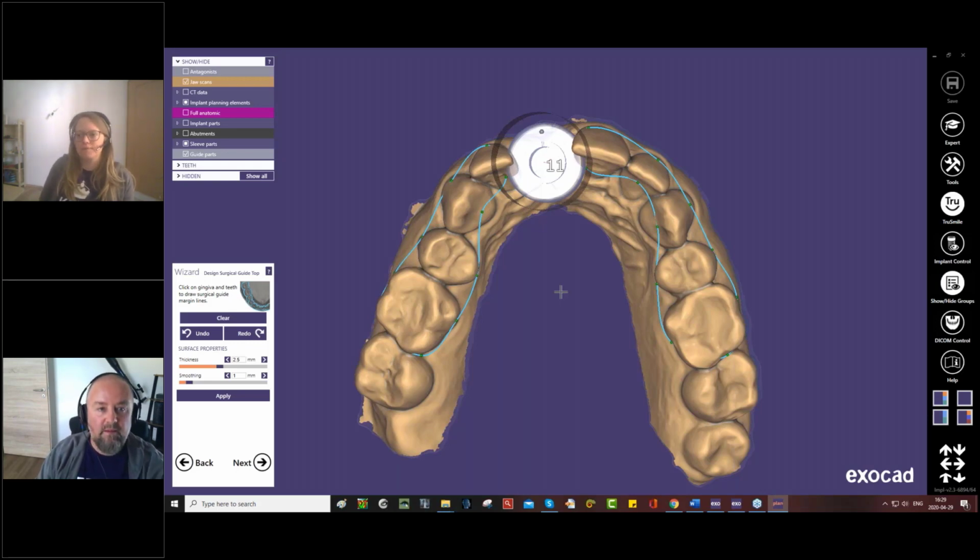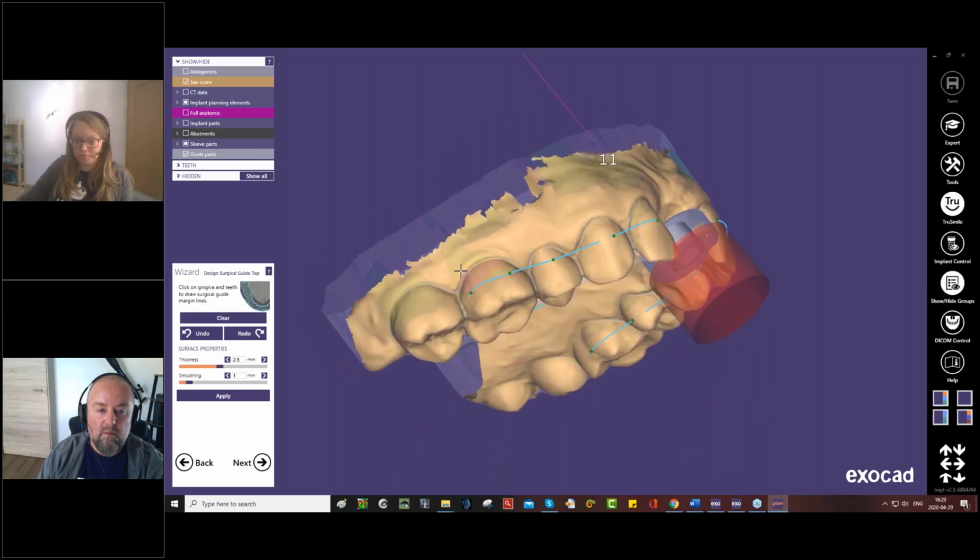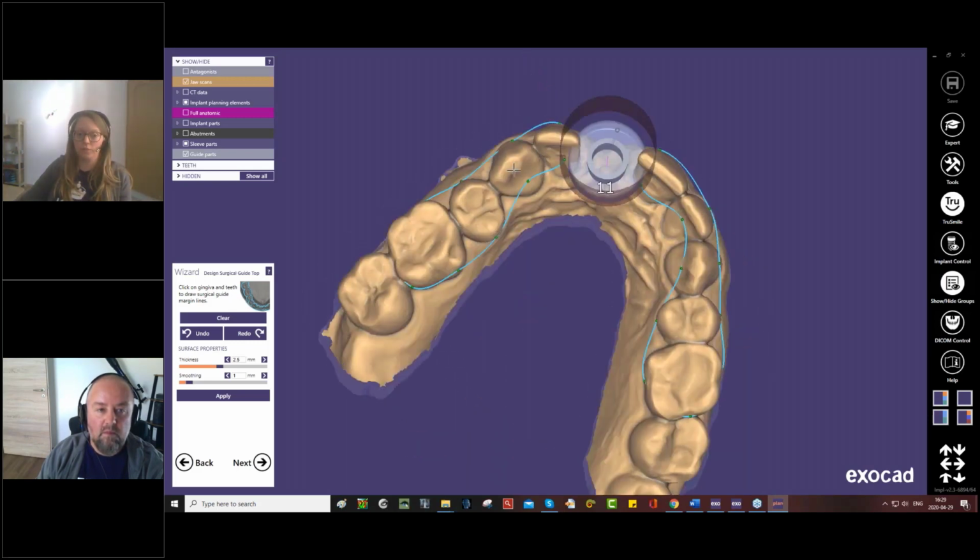I don't know. You can. Let's say if you place 2 implants in the first quadrant and 2 implants in the second quadrant, you can in this step make 2 guides at the same time. You don't have to connect them. But if you mean that you want to create a guide where all of the implants are in quadrant 1, and you just want to make 2 guides with different implants on it, you have to... I guess that's the situation.